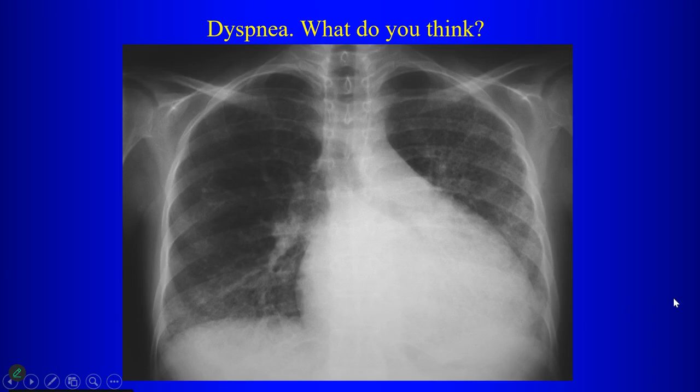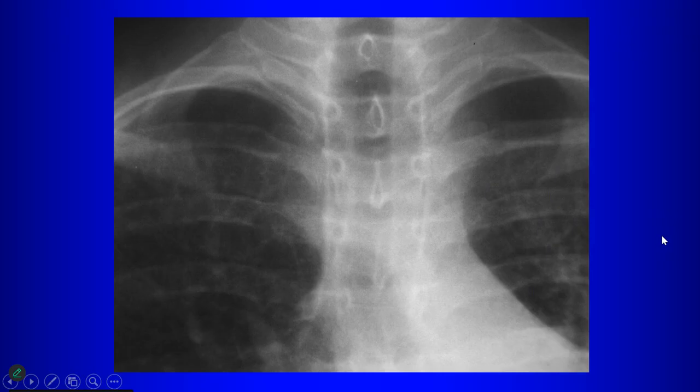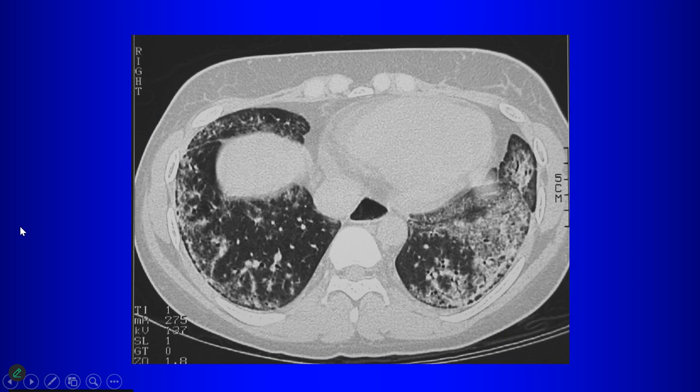This patient is short of breath. Besides the big heart, we have some interstitial opacities in the lower lung distribution. But I will give you this close-up. Tell me if you notice anything. Micronodules? No. No, we don't notice anything? All right, let's move on.